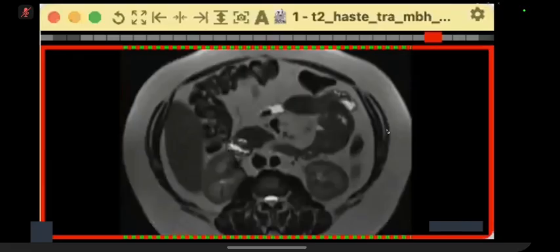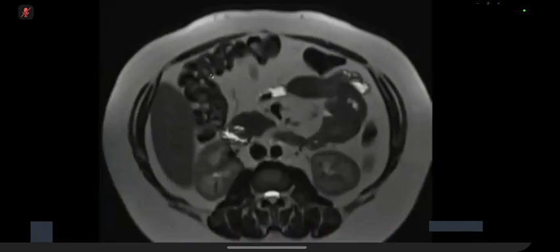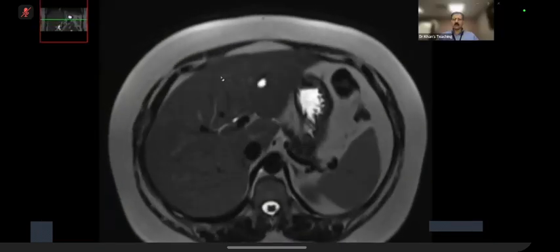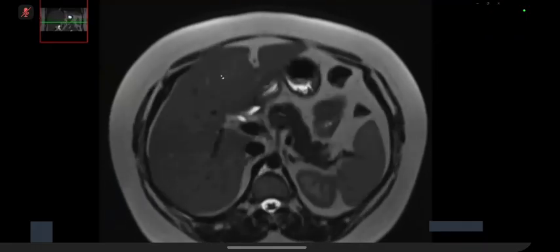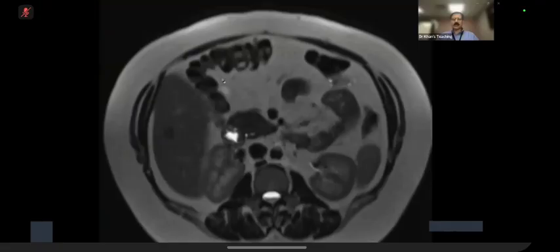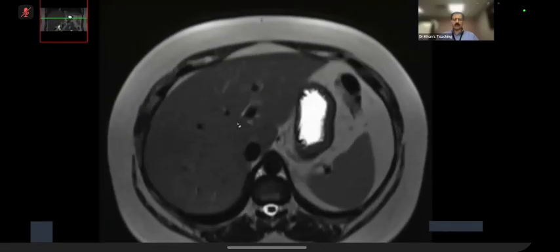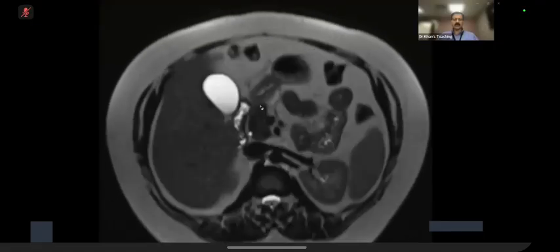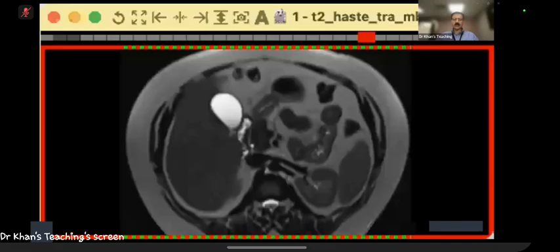Dr. Khan, please, the images are so blurred. I think this is different, yeah, this is much better now. So I'm showing you a T2, and there is something here. I don't want you to talk till now. Forget about the cyst. And please remember, it's a 26-year-old.